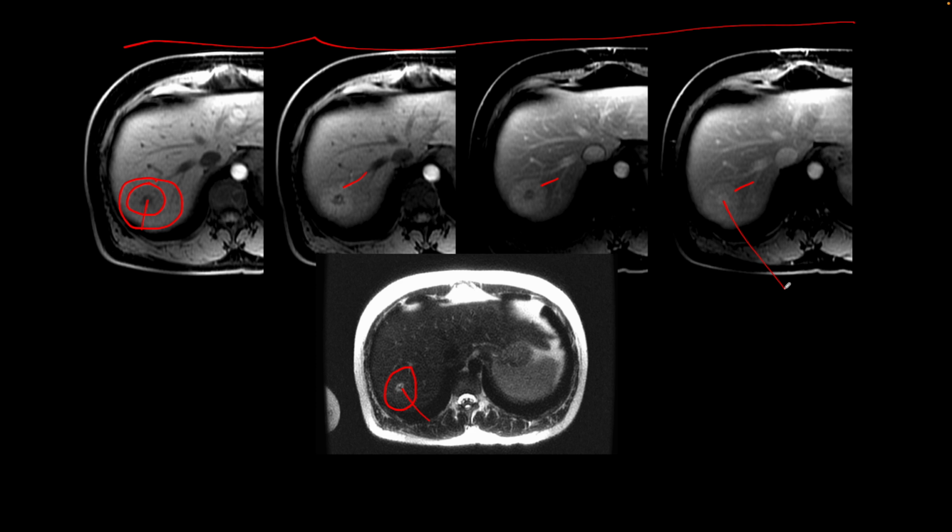It can look same or similar to a hepatic adenoma, and we want to do a follow-up MRI using EOVIST contrast if there is any doubt that a tumor is an FNH. The other classic features are that it has a central scar that is T2 bright, and the central scar also shows delayed phase contrast enhancement.